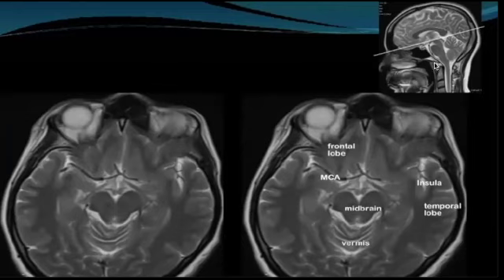Oh, no, I'm not relying on the picture above. No, I don't care about that. This picture is probably not even the same patient. Someone told me that they looked at the CSF within this image and assumed from that, but this is not the same patient. This is just used to identify where we are in the image.